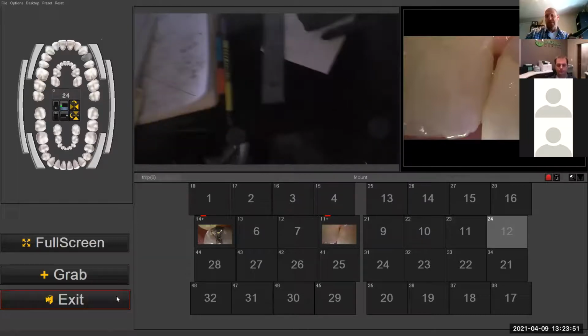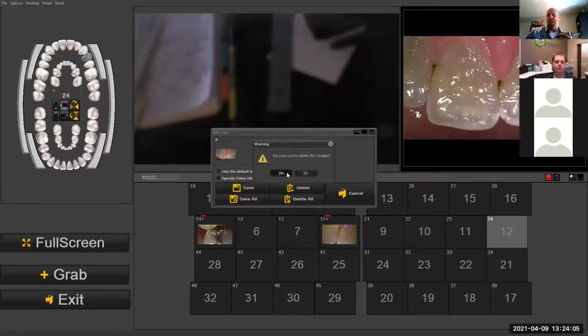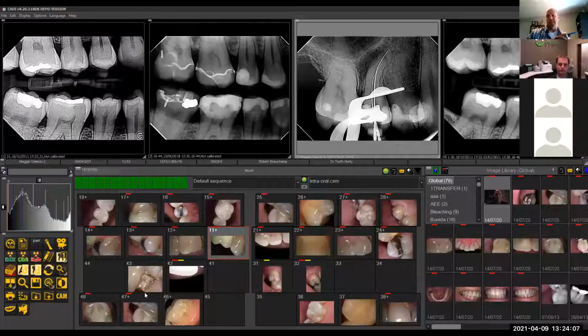And when it comes to using images in dentistry, we all know that pictures speak 1,000 words, and it really helps to enroll people to see the need for treatment. The big challenge is, where do you get the time to do all this? This is where you want software that allows you to get images in quickly and easily. By using sensors and being able to do an FMX in 5 to 7 minutes, it gives you that time now that you can use to get that camera to get those pictures in.